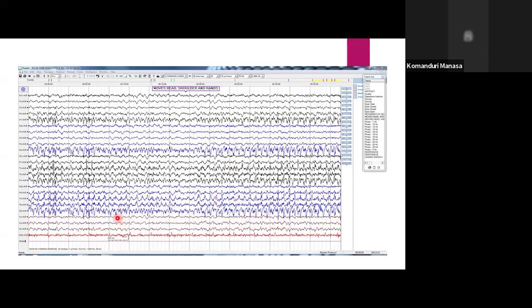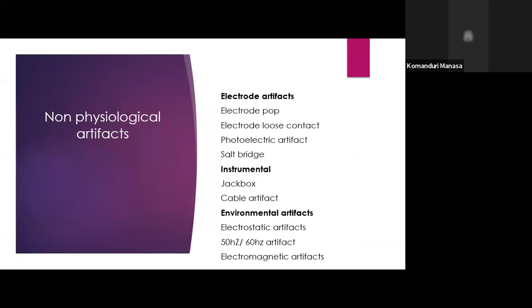So in post event slowing, we have to look at after some pages whether there is any focal slowing. Otherwise, you can time lock this with the movement, the EMG, and the video of the patient. So we can time lock with the video of the patient, or we can extend and see the after slowing in the EEG. In this patient, there is not much increase in the frequency. We notice the frequency is similar, and there is an out of phase deflection seen in the posterior.